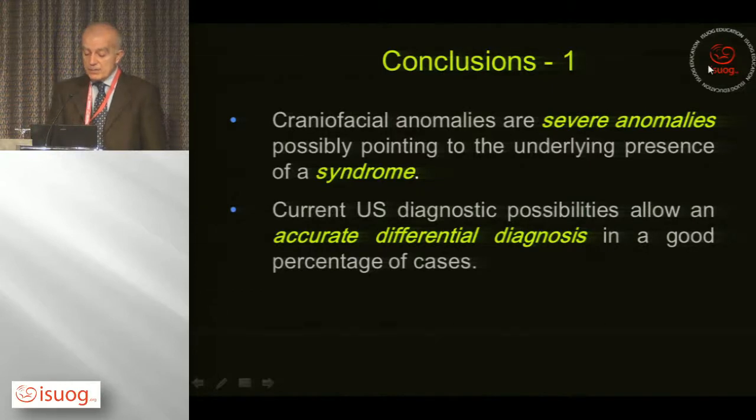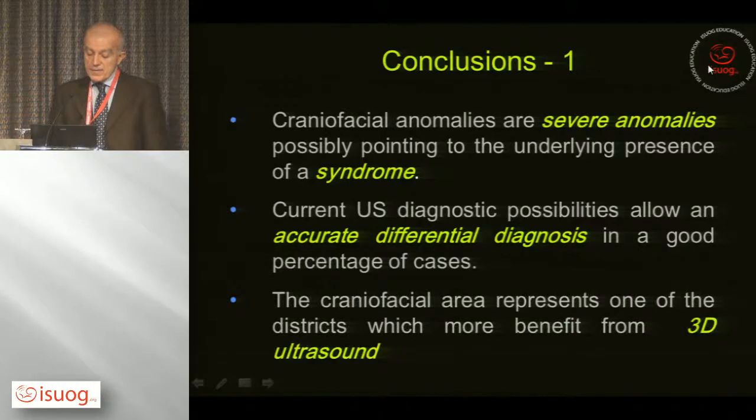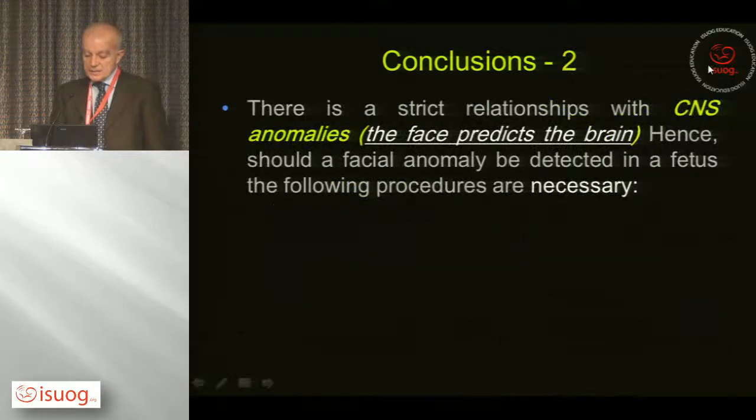Current diagnostic possibilities allow an accurate differential diagnosis in most of the cases, and this is one of the districts in which 3D may help us also in screening, I would say, because once you've acquired your volume, you may scroll within it and make your life easier, and you are maybe more confident in ruling out any diagnosis, but especially in expert assessment.